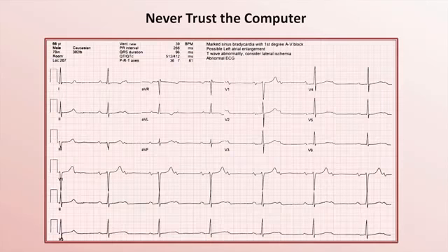Consider this EKG for a moment. This was taken of a patient who showed up to a pre-op clinic prior to an elective orthopedic procedure. He was seen by an anesthesia resident who took a look at the EKG and copied this diagnosis of sinus bradycardia with first-degree AV block into the chart before clearing the patient for surgery in a few days. After all, asymptomatic sinus bradycardia and first-degree AV block are rarely causes for concern.